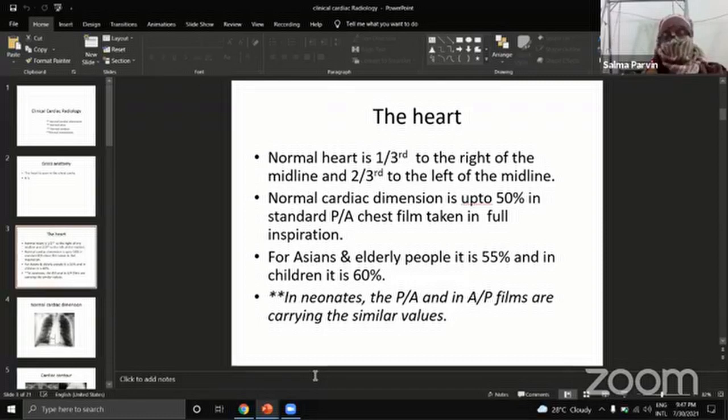And whenever the diaphragm is elevated, the heart has its transverse dimension more than usual, and there is more basal vascular crowding that is making a display of cardiomegaly and bilateral basal haze that is not expected in a normal person.